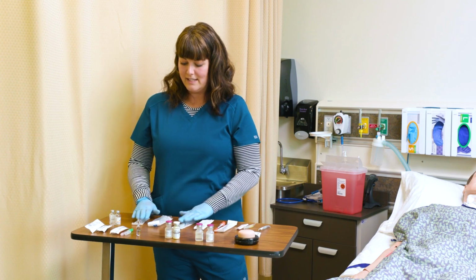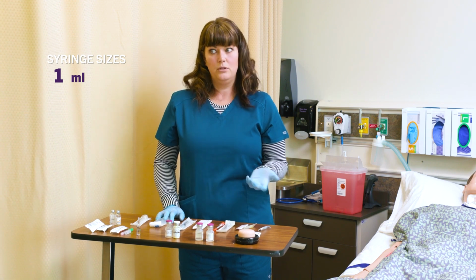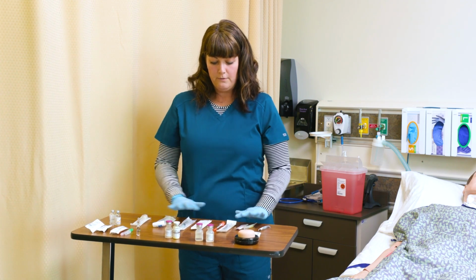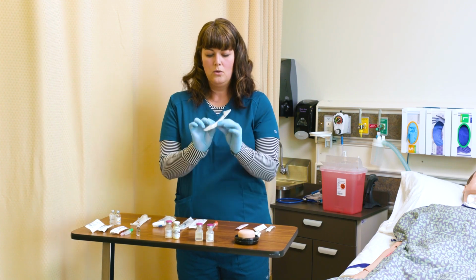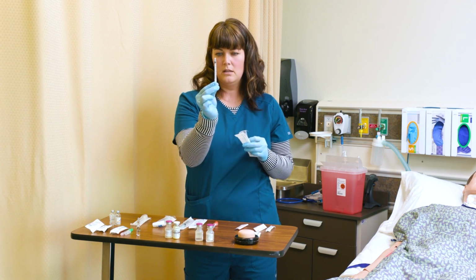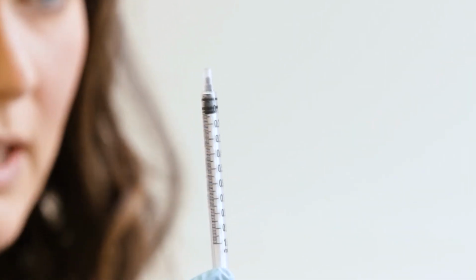So another thing is the size of syringes. We have anywhere from a 1 milliliter syringe up to 10 milliliter syringes that we can choose for injections. So I'm going to demonstrate and show you a few of these different types of syringes. We have just a 1 milliliter syringe. I'm going to open this and show you. You can see that the increments start at 0.1 milliliters and go all the way up to 1 milliliter.